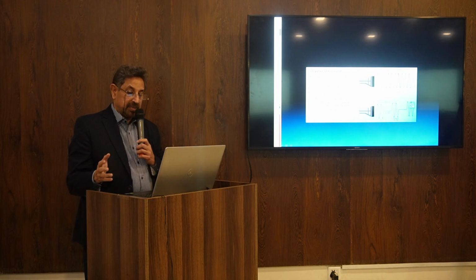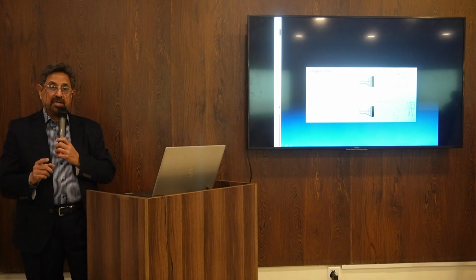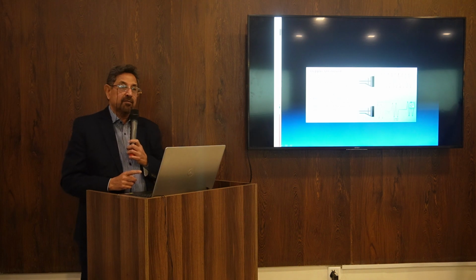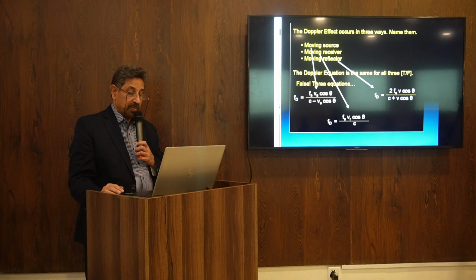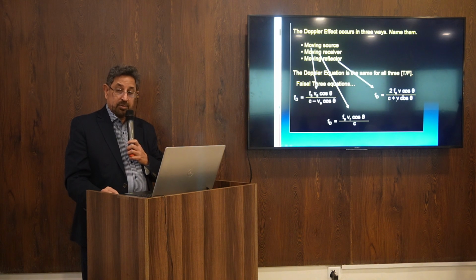There is a gap between the two, and here we have limitations. We have a picture, location, but we can't measure very high velocities. Very high velocities need CW. I don't want to teach physics, but it's very, very important to know.